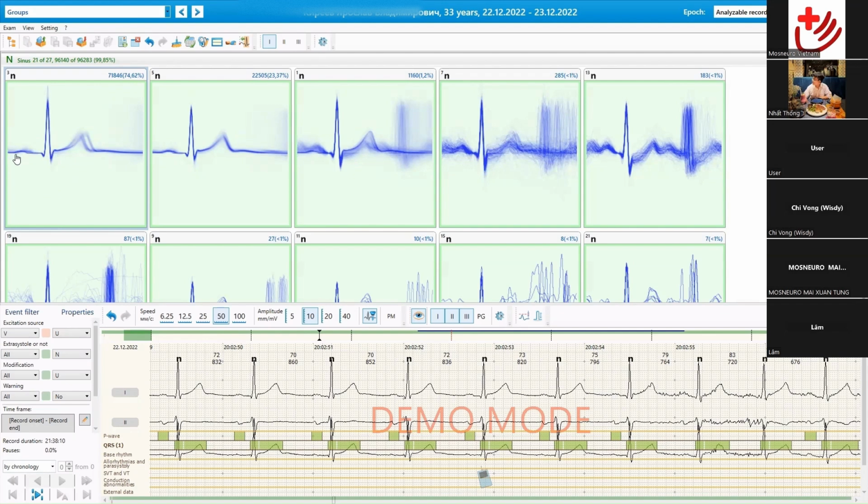Again, I see that the P wave is also a little bit blurred, quite bright, and a little blurry here. So I can understand that there are some PQ changes, but again, that's a physiological phenomenon, as PQ may change during day and nighttime. And then I see groups that consist of less and less complexes.